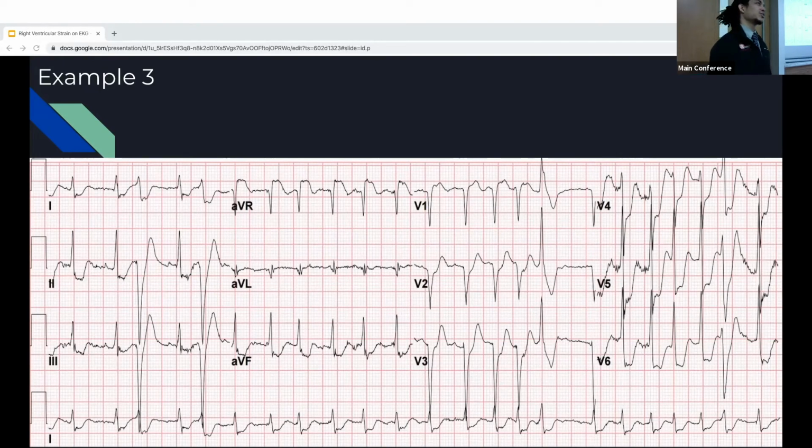And I think this was a relevant EKG to talk about in lieu of last week's lecture, because we were talking about ST elevation in AVR, and we discussed how often we cath patients with ST elevation in AVR that's not really a STEMI. They did discuss this in the study I was looking at, and they were saying that an ST elevation in AVR should have reciprocal changes everywhere. Basically ST depression in almost every other lead.